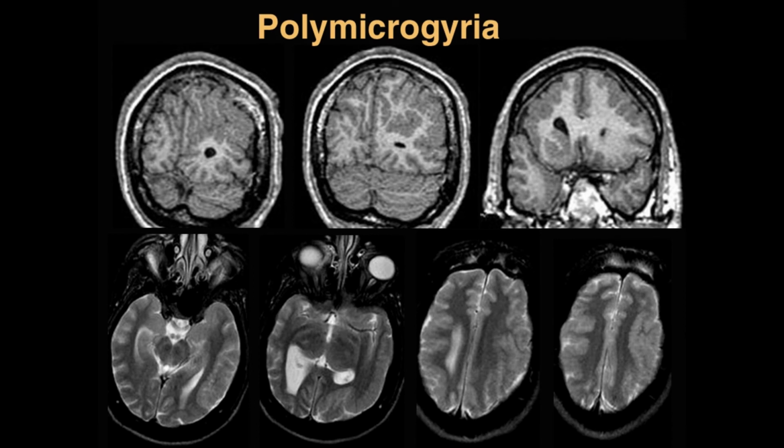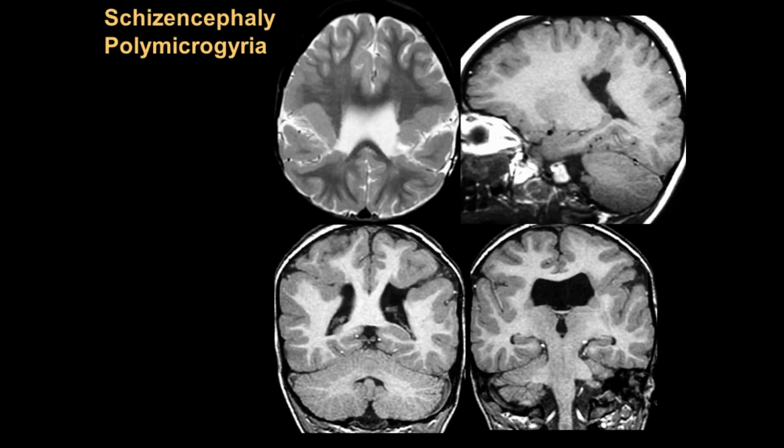These are MR images in a baby who had cytomegalovirus, which is associated with polymicrogyria. And as you look at this case, you sort of decide that the more you look, the more you see. You may at first jump to these areas of jumbled, busy cortex with this nodular appearance at the gray-white junction, but the more you look, you realize almost all of the cortex in this patient is abnormally lumpy, bumpy. This is diffuse bilateral polymicrogyria in a small brain due to cytomegalovirus.